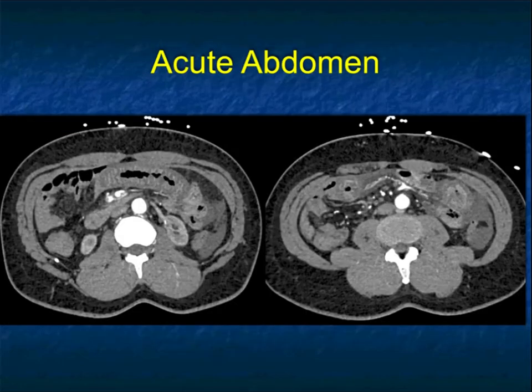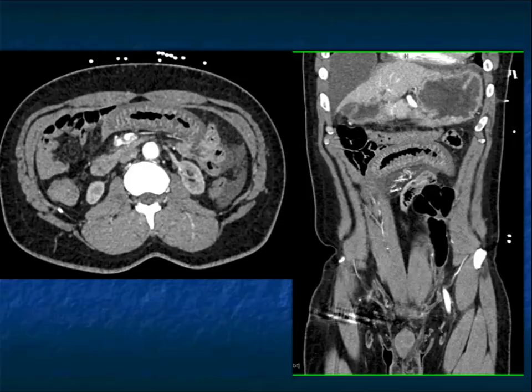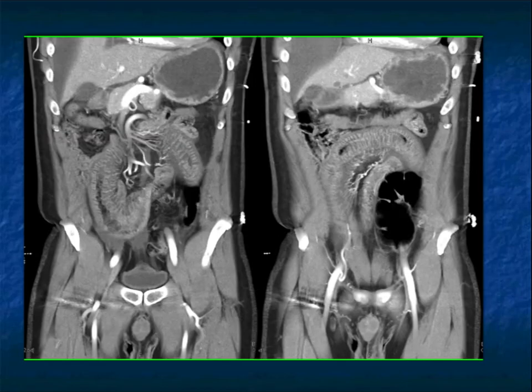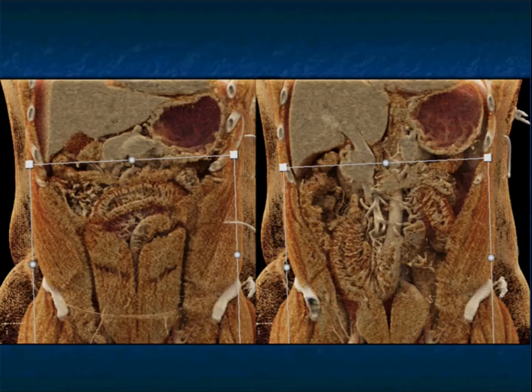Another case, again, very similar. There's free fluid present, markedly thickened proximal bowel. Look how thick that is. And look how extensive the bowel involvement is. Ascites, thickened bowel, prominent vessels. Again, you're going through all of your differential diagnosis, but you got to think about medication.